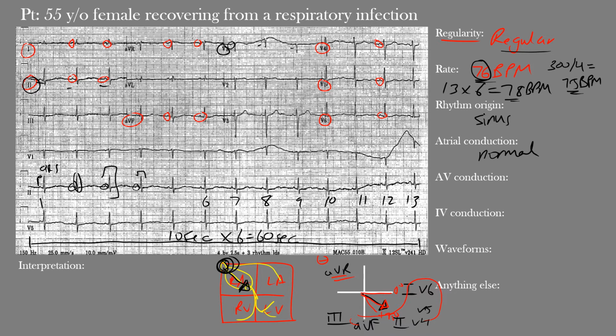Next, we look at atrioventricular, or AV conduction, and in this case, we're looking for conduction delays as the impulse travels between the atria and ventricles. Because the majority of the PR interval represents AV nodal conduction, we're going to take a look at that area, okay? The normal PR interval in adults should be between 120 and 200 milliseconds, or 3 to 5 small boxes, okay? And remember, in children, as they're growing up, it tends to be shorter, and as they get older, to the adult range, we see that 120 to 200. Our patient here is 55, so obviously an adult.